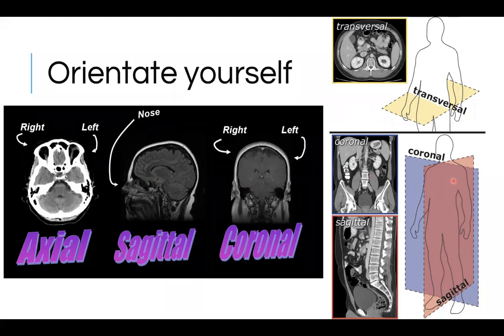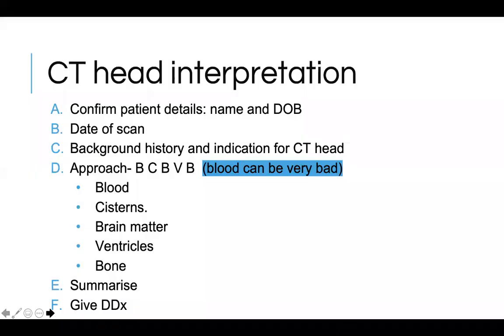So you can see that nicely here. Anterior and posterior behind the blue square. So it's just important with regard to every CT scan, whether it's CT head or brain that you're looking at, or CT abdo-pelvis, to remember which view you're looking at, because it can get pretty confusing if you aren't aware of the views and what organs you expect to see.